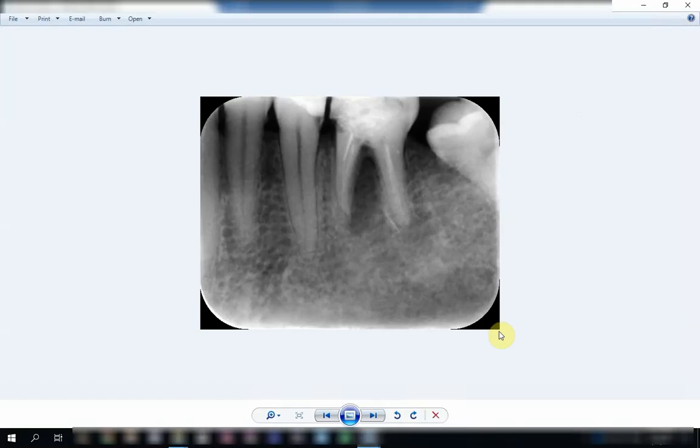When we have a look at the periapical radiograph, things will be a little bit different. Why? Because of the higher resolution of the image. Second, we cannot trace fully the course of the canal, so there is a bit of misunderstanding. Anyway, if you see this radiograph, this is the lower 4, this is the lower 5. You can see that the canal opening is this one, and this is the looping of the canal. So this is the mental foramen.